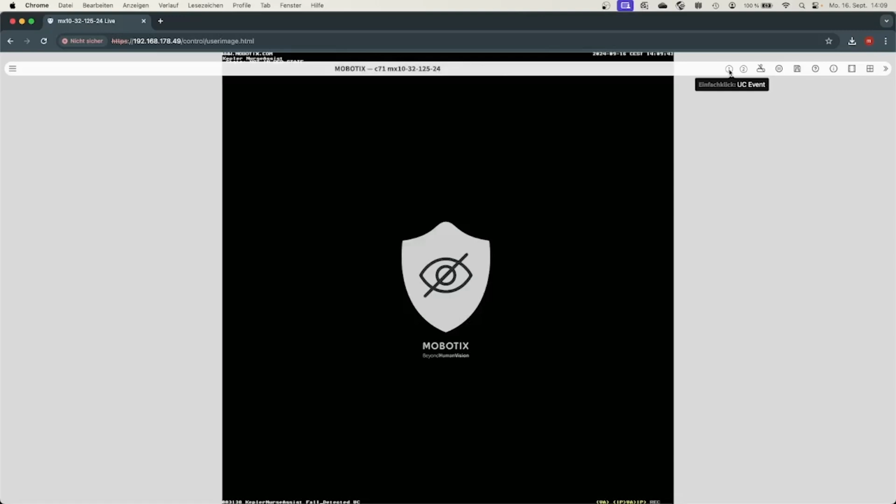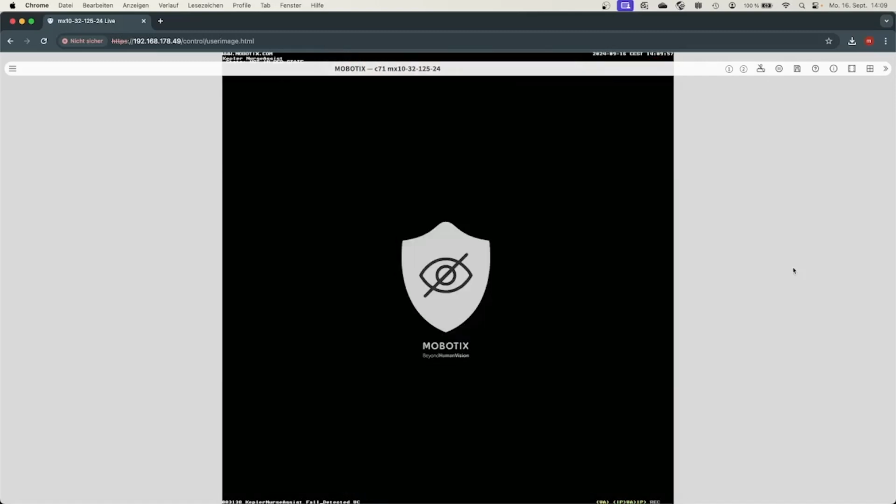now you can see it, we have selected. If we press it, it simulates a fall. Then the live image will appear. And of course, in this case, based on the demonstration purposes where the camera was mounted, we have also put privacy masking on it. So we have double or triple privacy, which is normally not required, but for this demonstration, we did that. And then we see how the functionality works. And after the time of 10 seconds, the camera automatically enabled the logo and protects the live image.